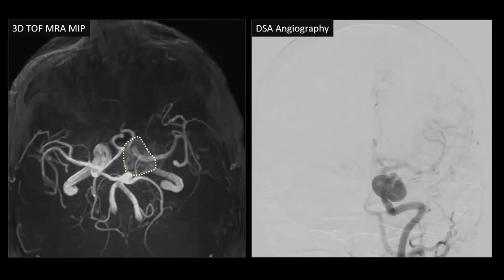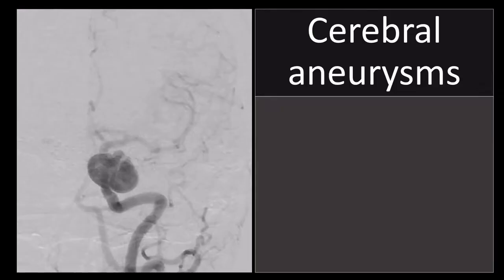internal carotid artery. And because this compresses the cavernous sinus, and especially the abducens nerve, so all oculomotor nerves, so the third, the fourth, and the sixth, they all run through the cavernous sinuses, but the third and the fourth are located in the lateral wall of the cavernous sinus and are a bit more protected over there, but the abducens nerve lies centrally within the cavernous sinus, very near the carotid artery, so it's very susceptible to being involved in a pathological process of the cavernous sinus. So compression here led to an abducens palsy.